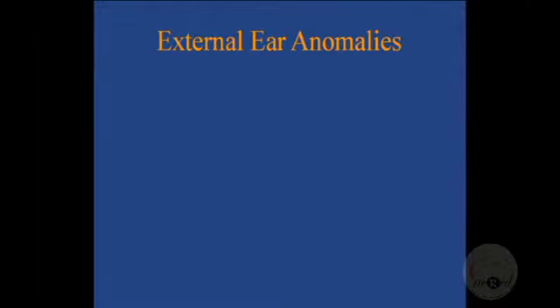Then I go through the external auditory canal, scroll through it, come back. Don't look at it as an image and then assess the individual things. You go lateral to medial or medial to lateral, your choice, but you have to scroll through that whole structure, assess it, and then go to the next structure, scroll through it completely, and go one structure at a time.